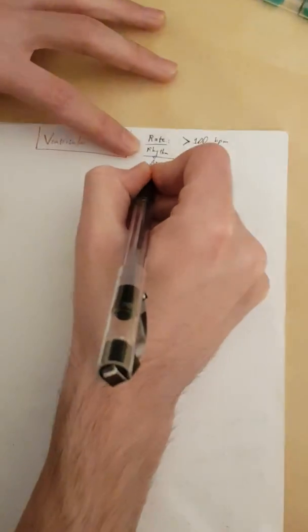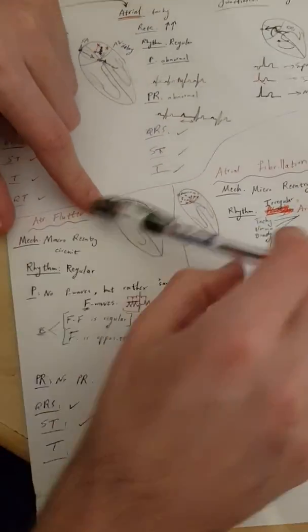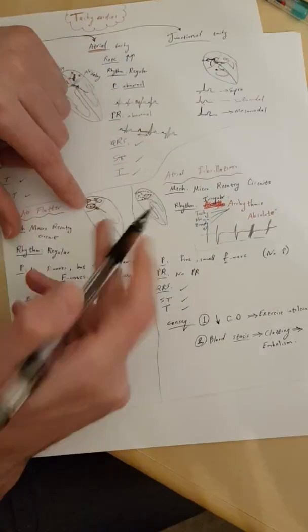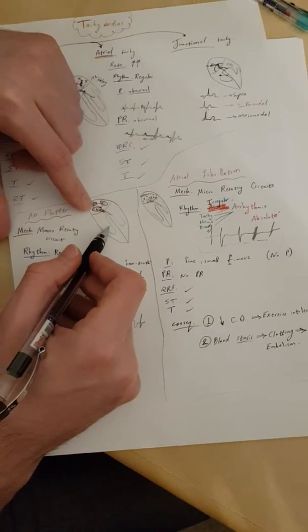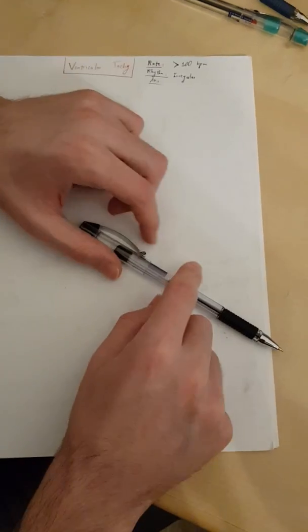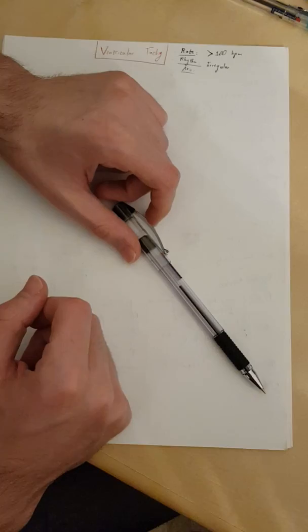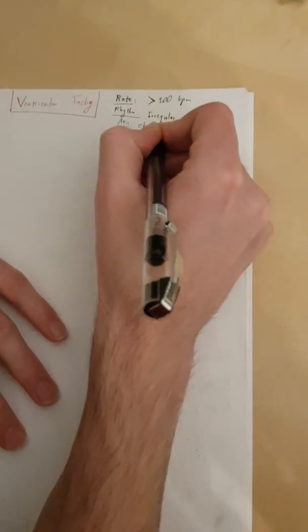Now axis, here's the thing. Normal axis in a normal heart should go something like this with the R wave, right there. But in this one, it can come from here to here, from here to here, because the focus can be anywhere in the ventricles. So we don't know, but it's definitely changed from the normal one. Even if it was, let's say, 60 degrees, and then someone starts getting a ventricular tachycardia, then it might be just 65. And this is still an axis change. So there's a change in axis here.